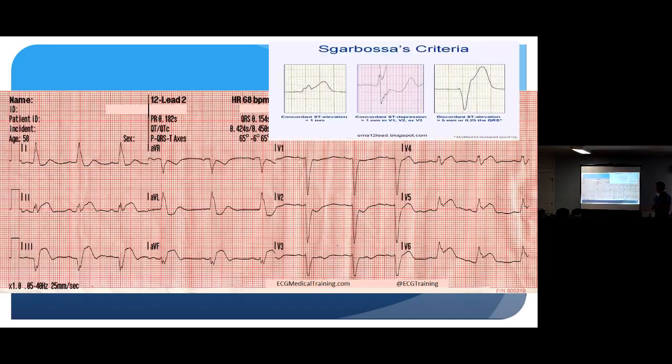There's some criteria that we can use called Sgarbossa's criteria to look at left bundles to say, is it new or old? Before 2013, a new left bundle in chest pain was considered a heart attack. They went to the cath lab. We don't do that as much anymore, but the short version of Sgarbossa is if you have discordance, that's good. So if I'm lead III here, my QRS is down, T wave is up, not super scary. And this is more than a big box. Discordance is good, like in a relationship, right? It's good to fight, right? Concordance is bad. So QRS and T wave in the same direction with elevation, that's a STEMI, okay? And then concordance down in V2 or V3 is also bad.